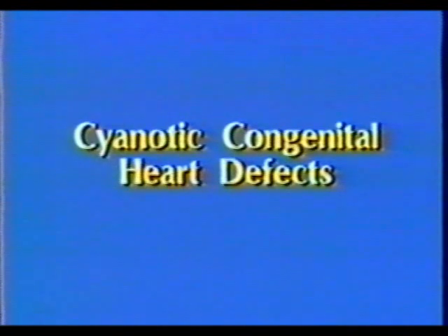We will now discuss cyanotic heart defects. Since it is beyond the scope of this series to present a comprehensive review of cyanotic lesions, what we wish to accomplish is to describe a systematic approach for assessment of these patients. We will then show real-time examples of a few selected conditions.